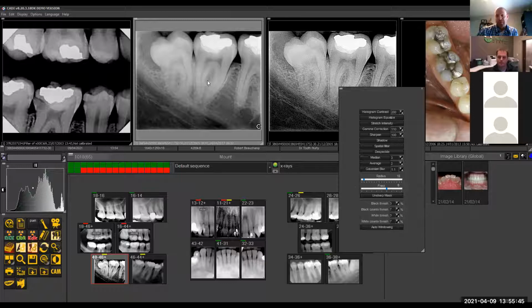Yep. So when you look at an image like this, if I take three or four of these features and click on them, you'll see how the image changes just by clicking. So you see how that quickly changed. Then I can put in a sharpen, then a gamma correction, then a stretch intensity, then a little Gaussian blur. So we do six or seven or eight different things to achieve one filter, and then we program that into the software.